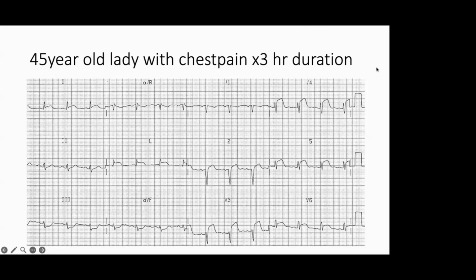You can just read it. I will help you to read it. Starting with this ECG, we will go very systematically. Then we'll go fast because this ECG is abnormal. This is not a normal ECG. Most of the people will know the diagnosis also, but we just want to know how to diagnose this one, and why it is so.